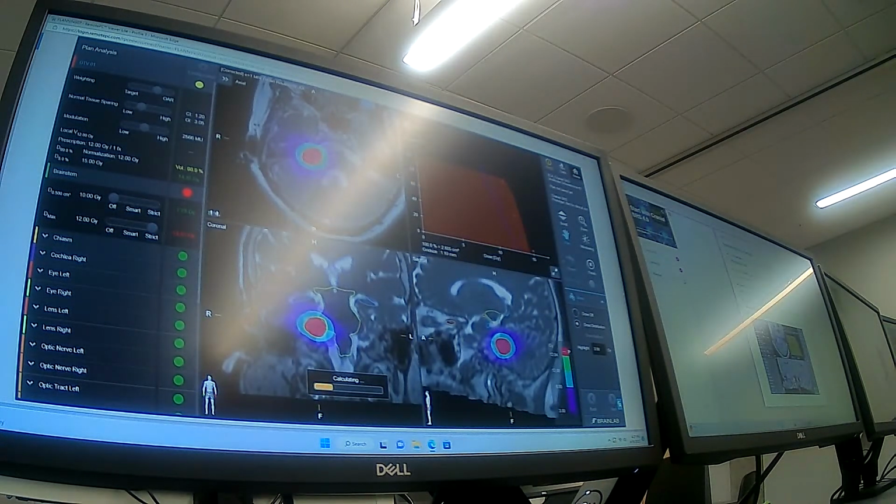So sometimes if you're not getting agreement on a calculation, it could be your contour. So maybe you go through them and look at it, but your contour can be a little generous in certain areas, more than it should be. Definitely a good line with the optimal. Okay.